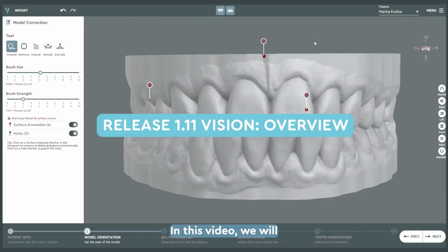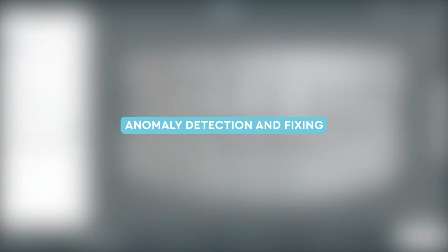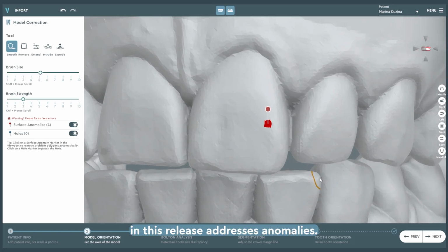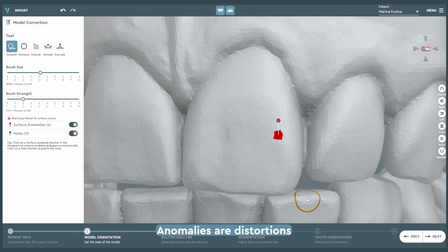In this video, we will review the main functionalities introduced with the release of version 1.11. Anomaly Detection and Fixing. The first feature in this release addresses anomalies. Anomalies are distortions on the surface of a 3D object that can cause issues during deformation or printing. These distortions need to be fixed to ensure smooth workflows.